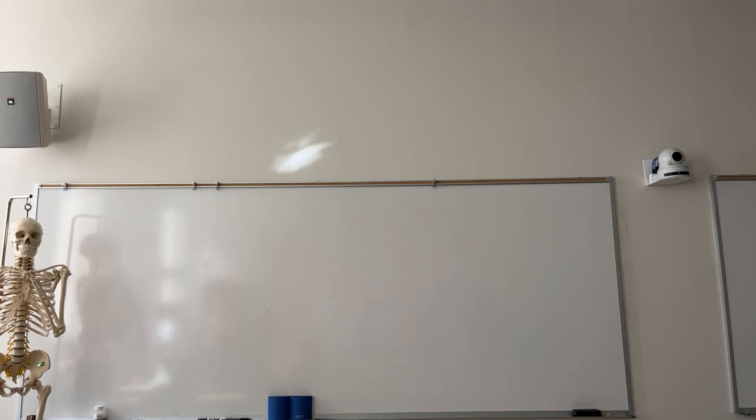All right, to answer your question, 65. Here's a number of questions. There's fingers, hand, finger, hand. Is there any labeling?